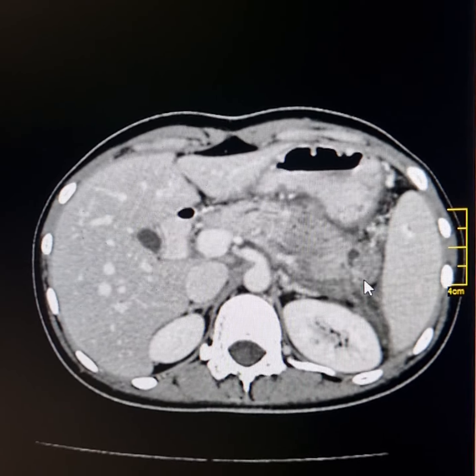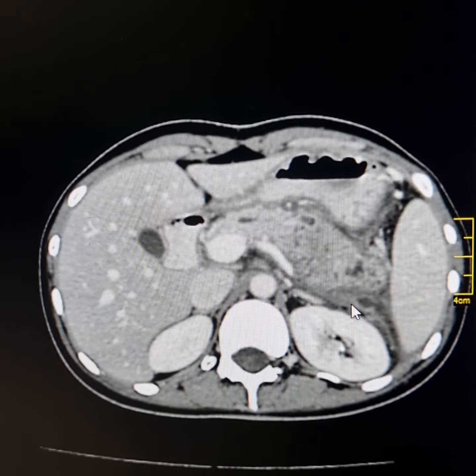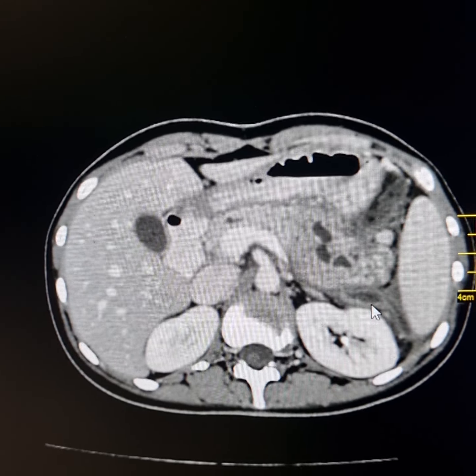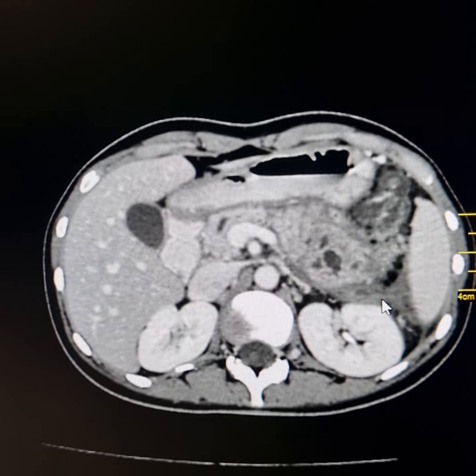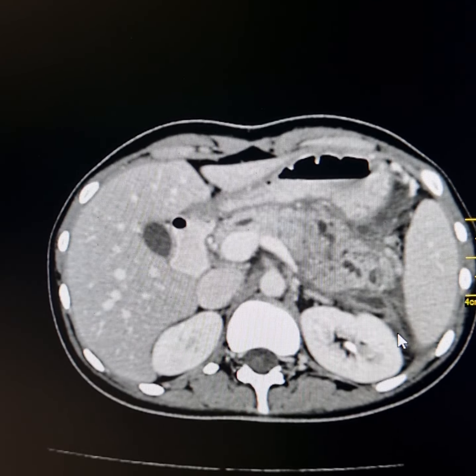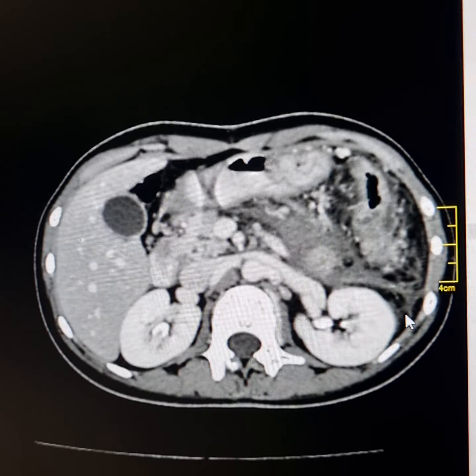or splenic artery. Now this is the increased density of fat in the left anterior pararenal fascia. This is a small fluid collection here showing wall enhancement. This may represent a small abscess here. The anterior pararenal fascia and lateroconal ligaments, now these are thickened.